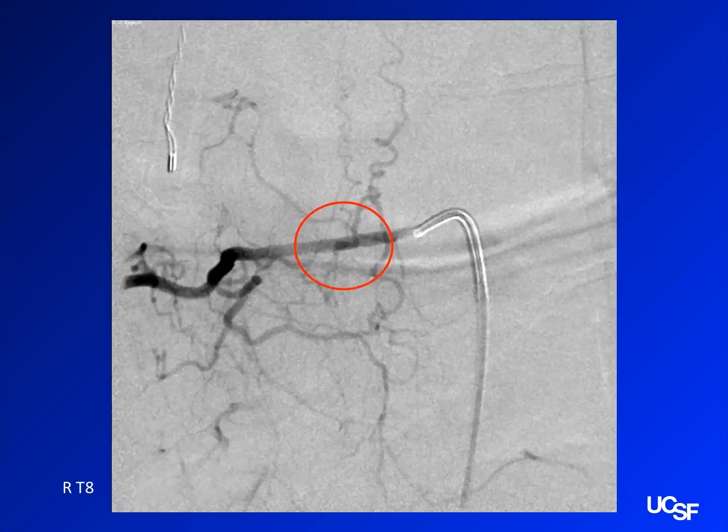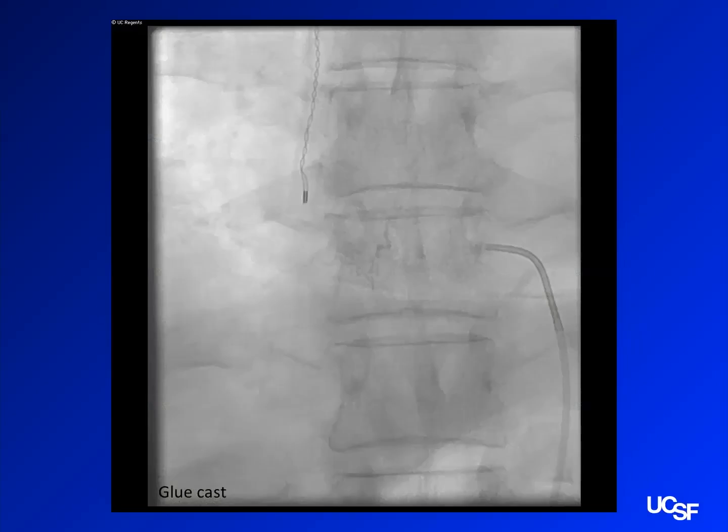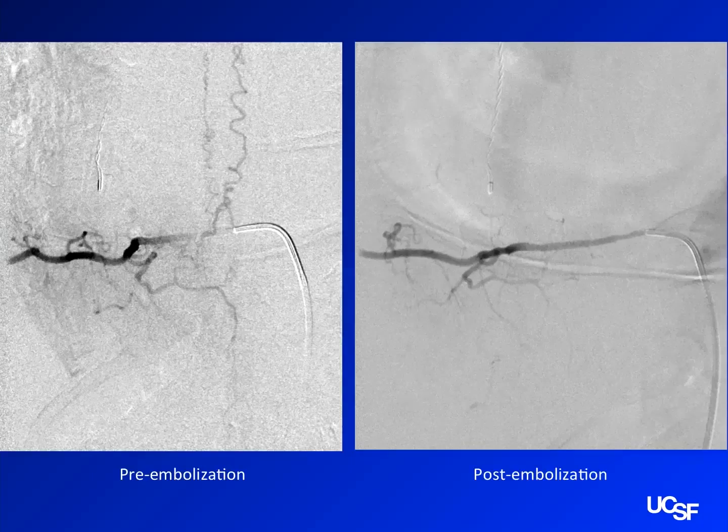Here's your fistula. They put in a catheter, they put some glue in there, and they close it off. The patient is cured. Okay, they may not get their walking back, but they will not progress further. Whatever level of walking he has, they won't get any worse.